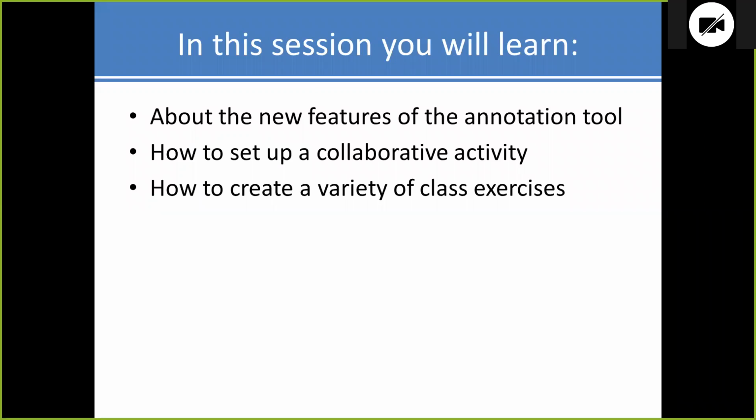Okay, so in this session today, you will learn about the new features of the Slice annotation tool, how to use them to set up a collaborative activity, and how to create a variety of class exercises by changing the settings within the annotation tool.